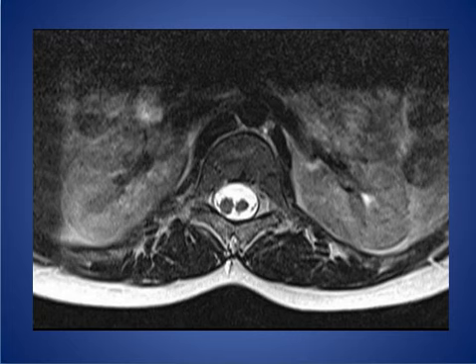Here, this is our second case, an 8-year-old patient with abnormal gait, and we see here an axial T2 MRI image with 2 cords, and this we call diastematomyelia.